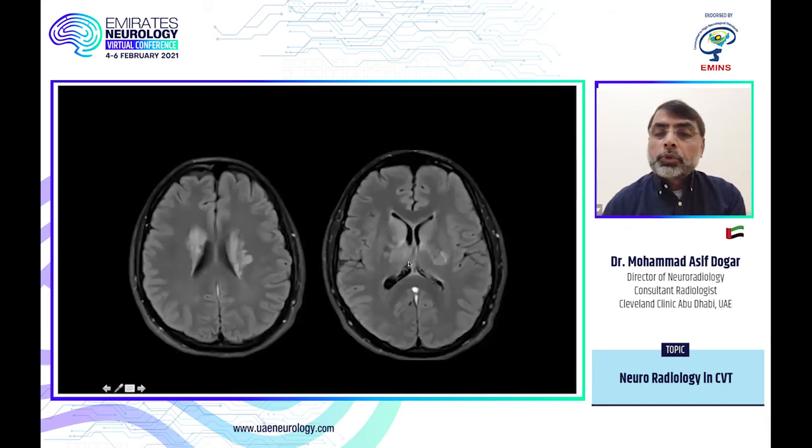On the T2 weighted FLAIR images, you see the edema in the caudate nucleus, here's the lentiform nucleus, caudate, the thalamus here. But the clue to the diagnosis is look at the veins here. So this is hyperintense. It should be dark like this, like the superior sagittal sinus. But due to the clot here, you can see hyperintensity in the veins.